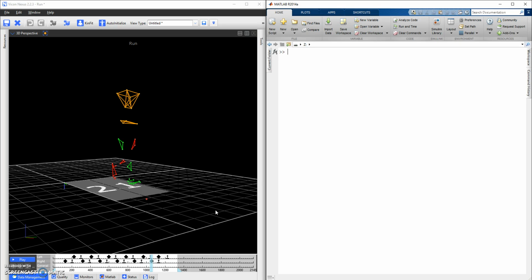I'm going to give you 3 key commands that basically will set you up and you can do almost everything with. And then I'm going to go into a little bit more depth and explain a couple of the functions that I find really useful.